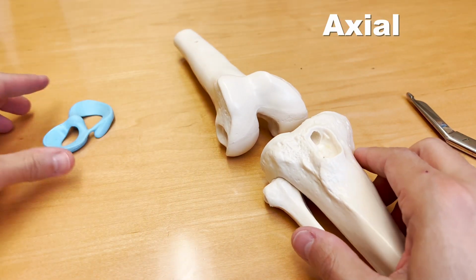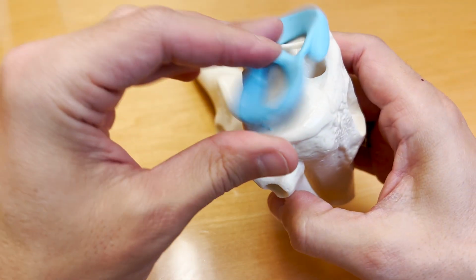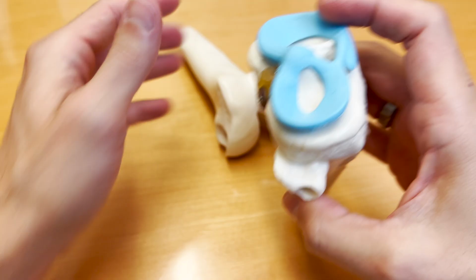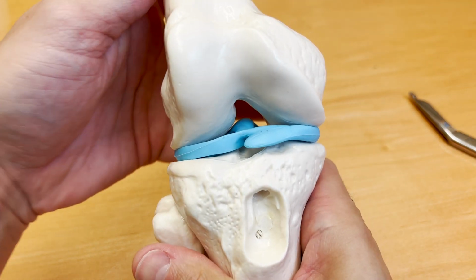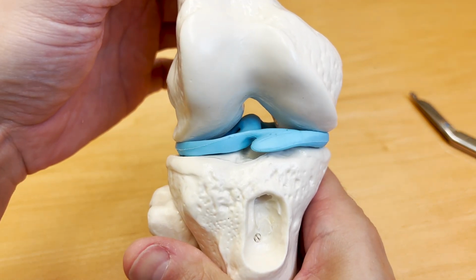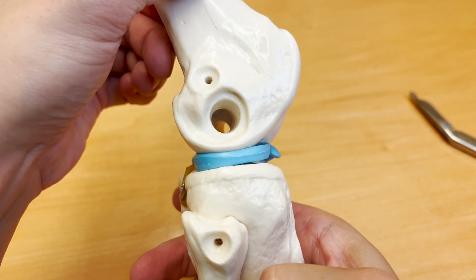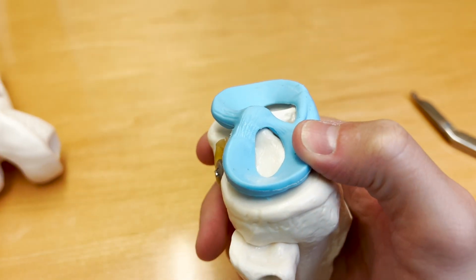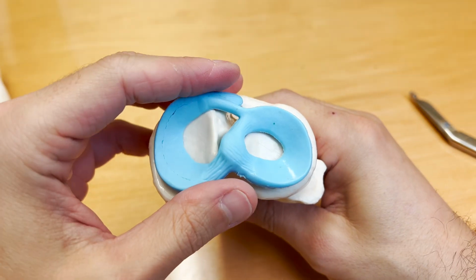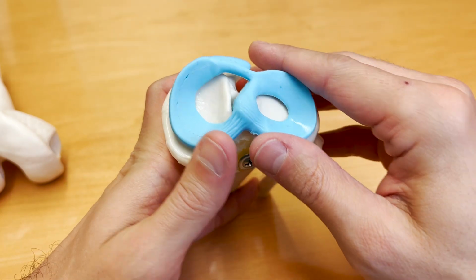And over here I've got my meniscus model. So the meniscus just sits right on top of the knee just like this. So this is what it looks like put together. So that's the meniscus looking at it straight on the coronal. That's in general what the meniscus looks like on the sagittal. And then if we take our knee apart and look at it from top down, the meniscus will look like that.